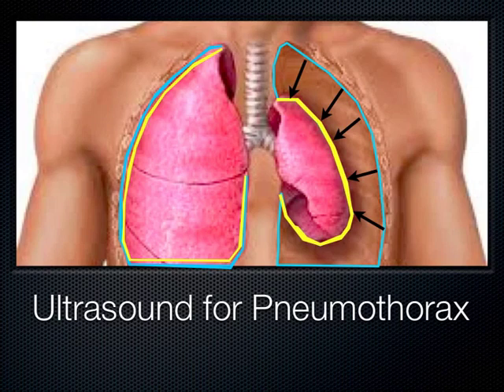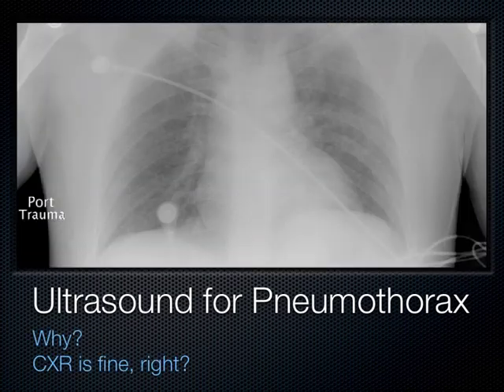So what about chest x-ray for pneumothorax? You have a patient who's short of breath, you get this chest x-ray, it looks like the lungs are inflated, it couldn't possibly be a problem, right?